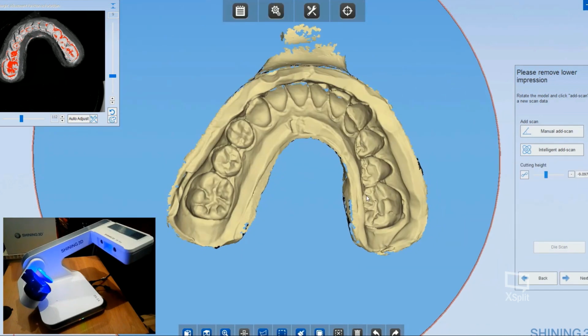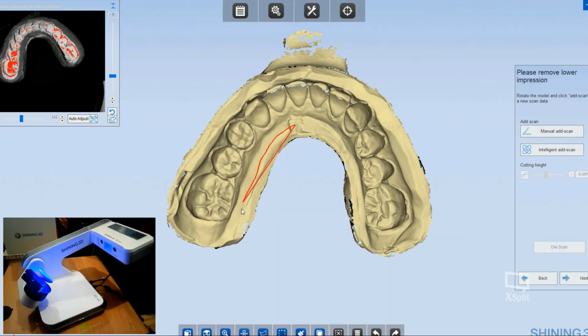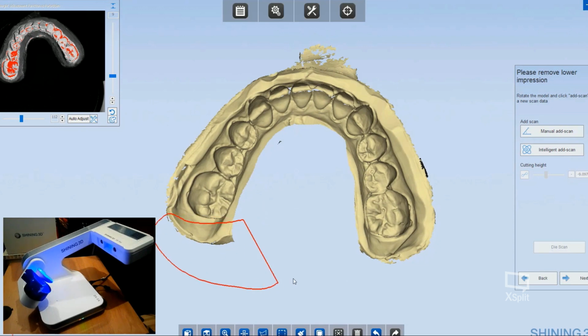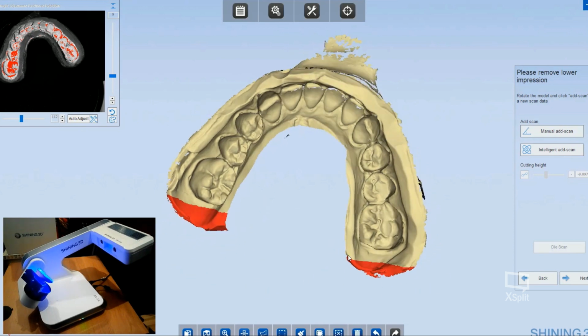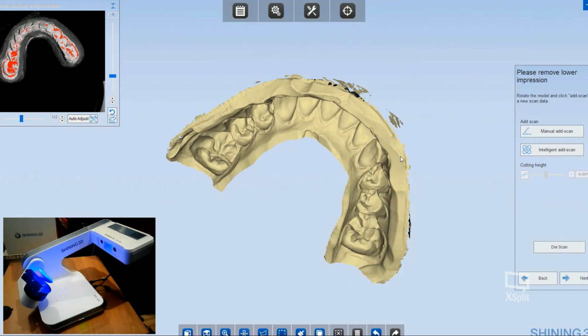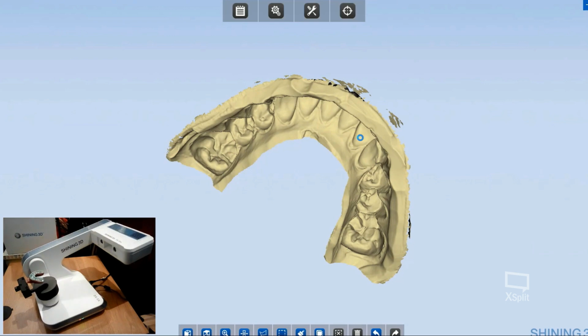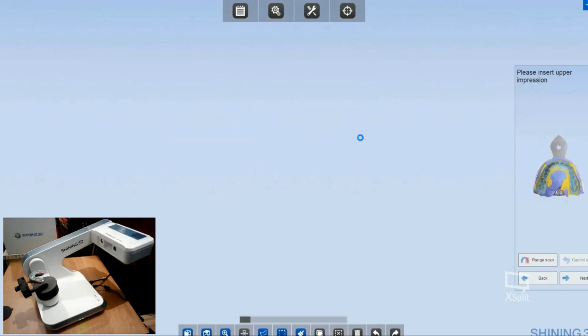Exit. Okay, now I can clean my point cloud working with the different kind of selection tools. For cleaning the point cloud it's just necessary to delete what I don't need. So this part, and so on. I can delete also at the last step of the acquisition process.